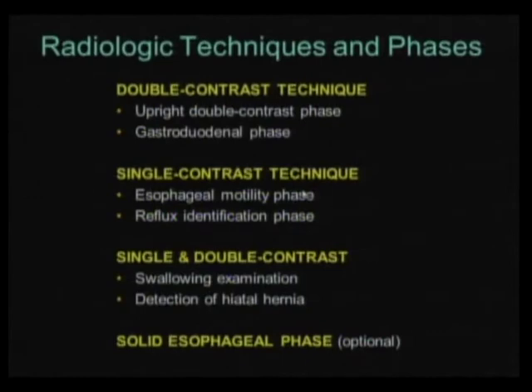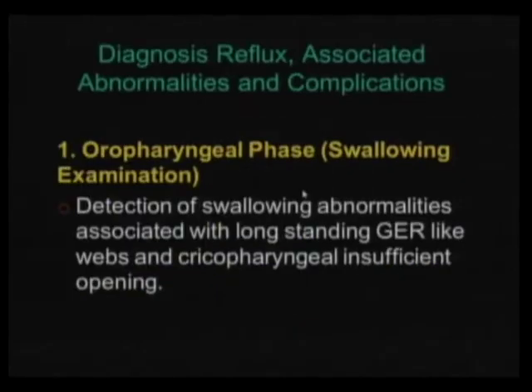In some cases, when we are looking for subtle esophageal strictures or want to measure the stricture, we use esophageal barium pills or tablets that we ask the patient to swallow, and see if they stop in some areas where we can recognize that there is a stricture.